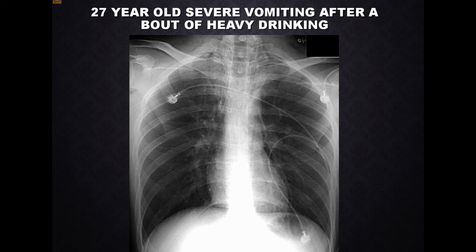So, a 27-year-old man, severe vomiting after heavy nights out drinking. What do you see? Normal? Then go home?